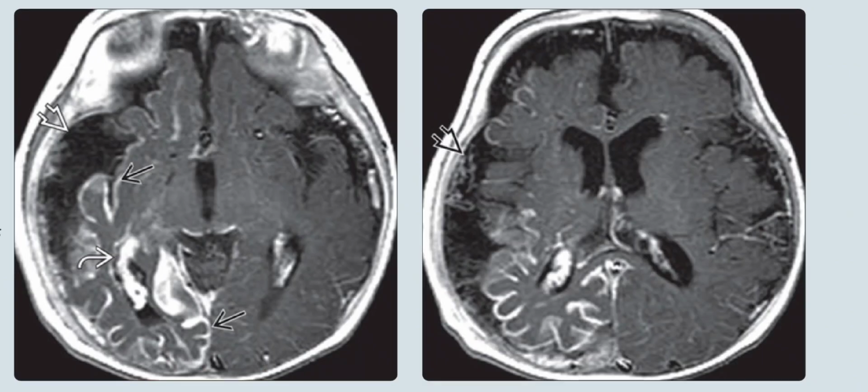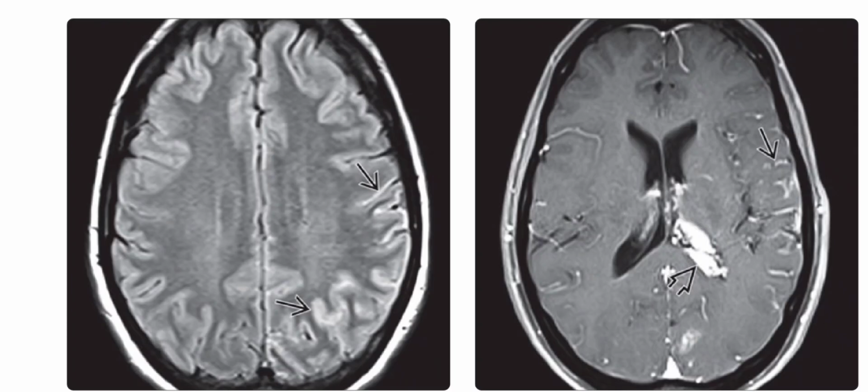Left is the axial T1 contrast-enhanced MRI, and it shows the classic Sturge-Weber syndrome with atrophy of the right hemisphere, enlargement of the ipsilateral choroid plexus, and an extensive pial angioma covering almost the entire surface of the hemisphere. Right is the more cephalad T1 contrast-enhanced scan in the same patient, and it shows similar findings. On this image, a cluster of dilated vessels in the subarachnoid space is also visible. Some more cases of Sturge-Weber syndrome.